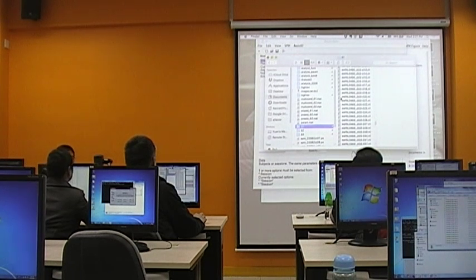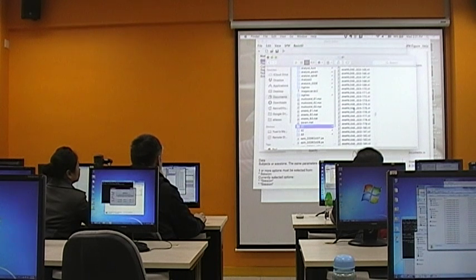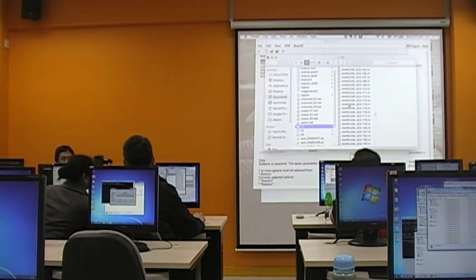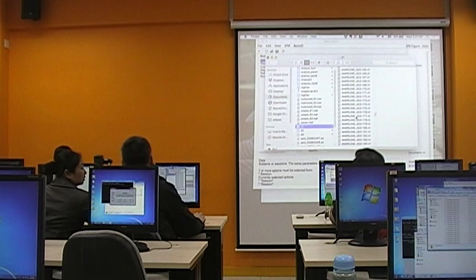So you warp your image to the standard template. And then the last step of pre-processing is smoothing, so you add an S. Now for the kind of data analysis we are going to do today, we are going to use SWA, F and L. So this series of files.